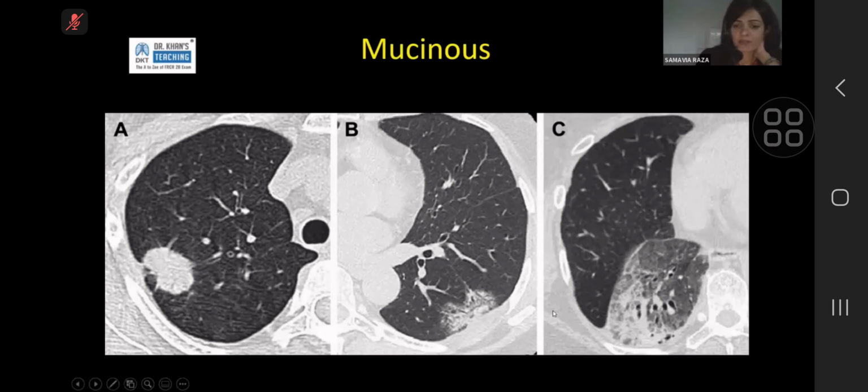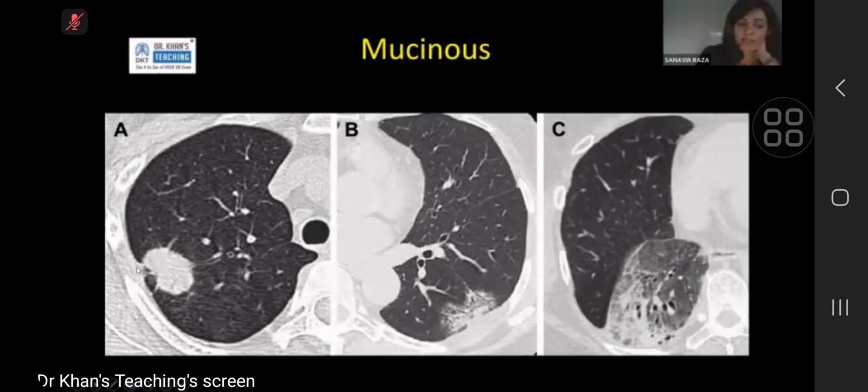These are just adenocarcinoma spectrum lesions that I'm showing you. You can have a spiculated lesion, and you can see here the tethering of the pleura that I told you about. This can happen next to a fissure, and this can also happen next to the other side of the chest, the external pleura. You can have a part ground glass, part solid lesion. Sometimes they pull the pleura towards them, sometimes they infiltrate the pleural space and the extrapleural space.